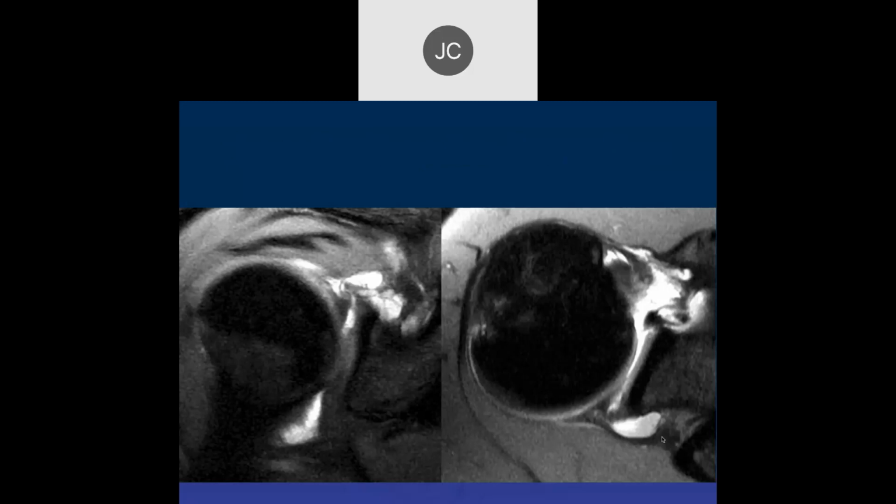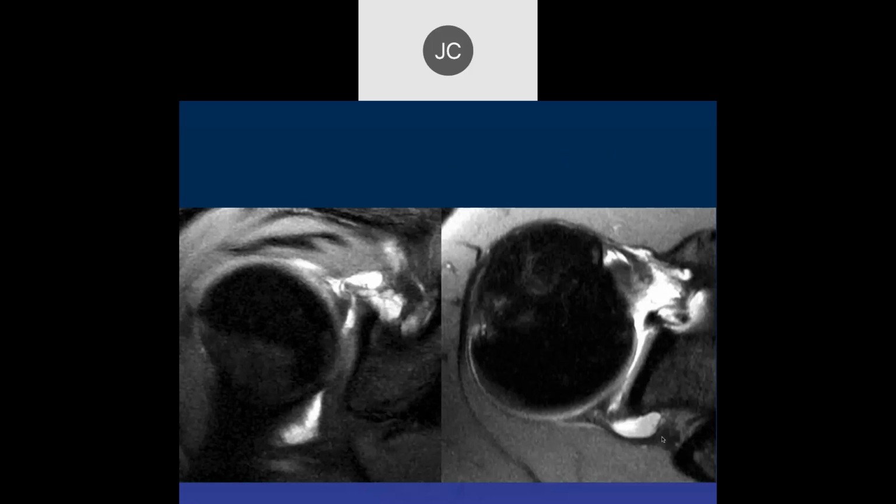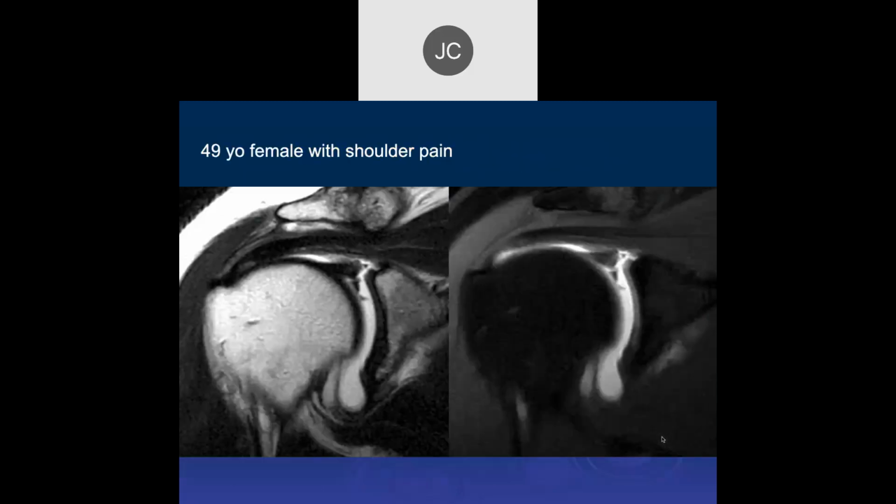Okay. Let's see, is this the same one or is this a different one? Yeah. Okay. Here we go.